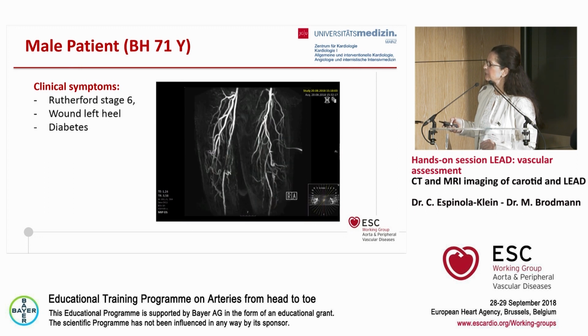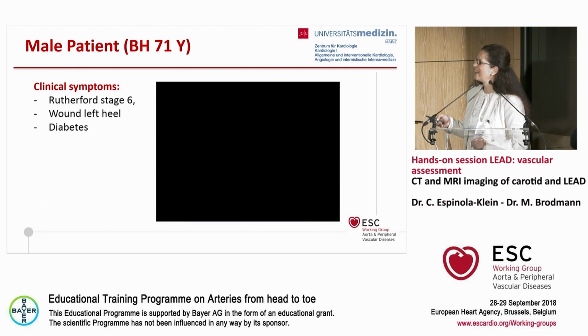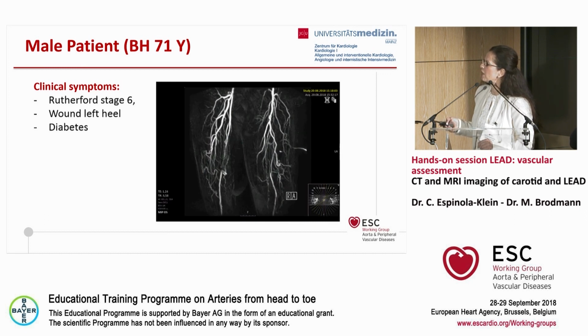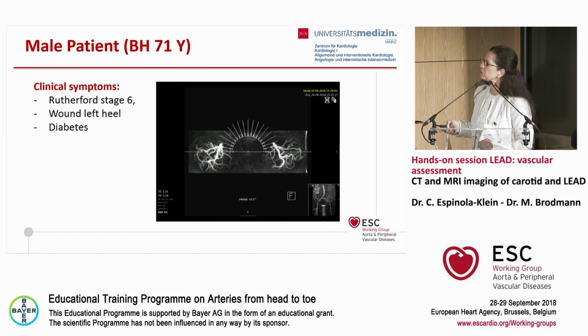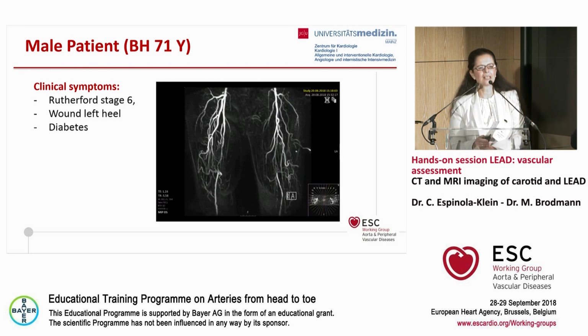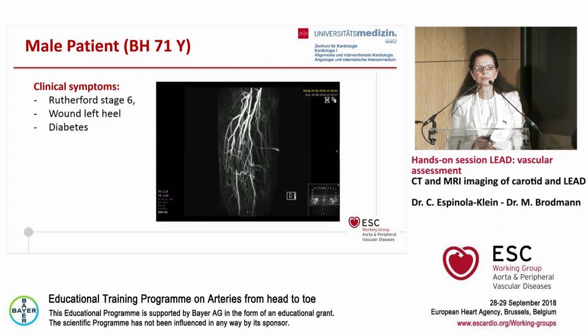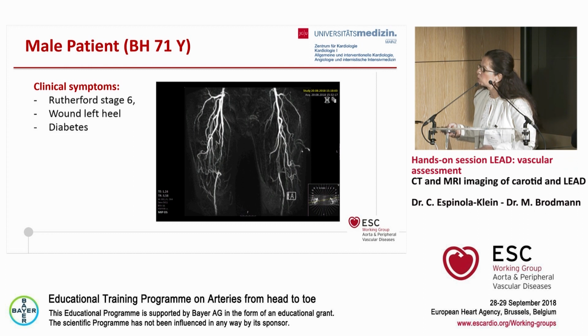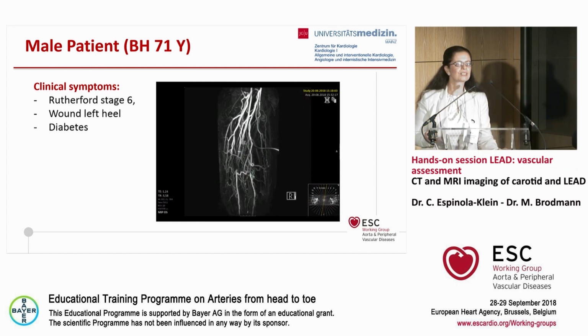So here you can see there is a long occlusion and a short occlusion on the other side. So the left superficial femoral artery is occluded. The right is also occluded, it's true. But we have the problem on the left side.